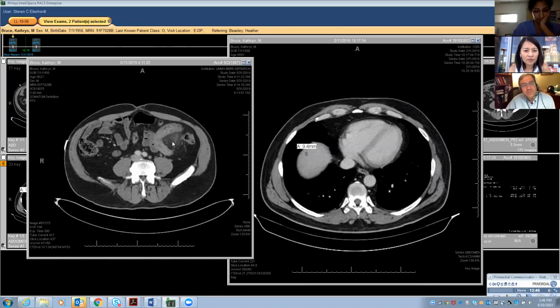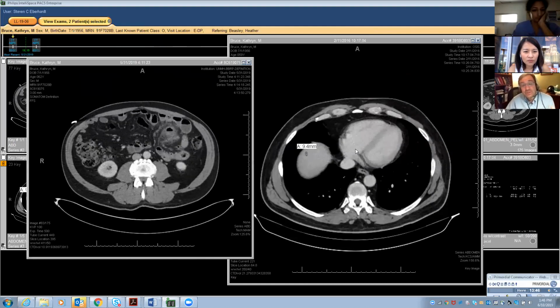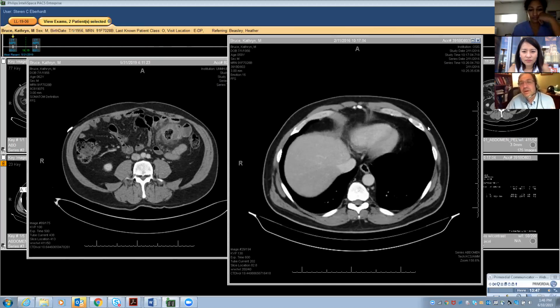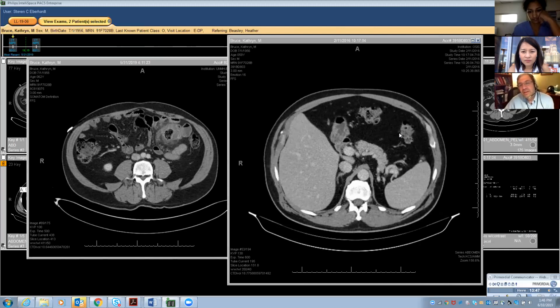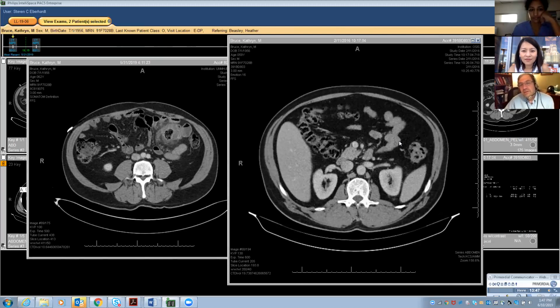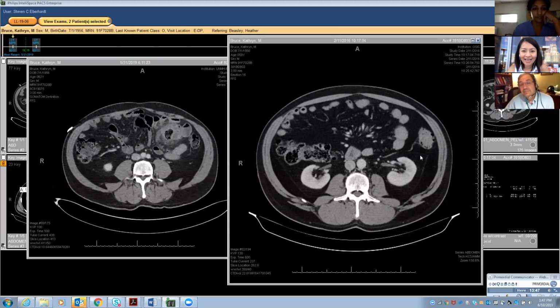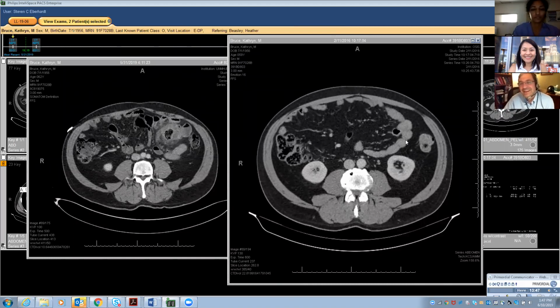And on that one coronal image especially, it did look like a hole with an inflammatory reaction around it. So this is very helpful, and the dates on this are more or less accurate. This is May 2019. This is going back to an available exam from February 2016. And if you look in that area of small bowel, you see that there's this. Is it a fat attenuation or is it just a diverticulum? Okay, there it is. Yeah. So now you know that it's basically a small bowel diverticulitis, because you have a suspicious-looking giant diverticulum on the small bowel several years before.